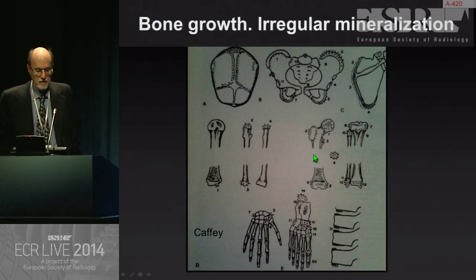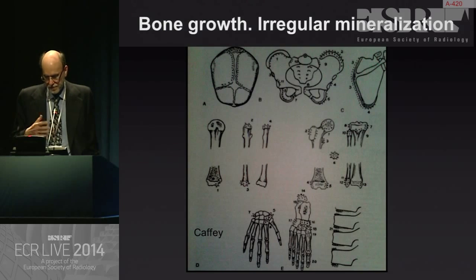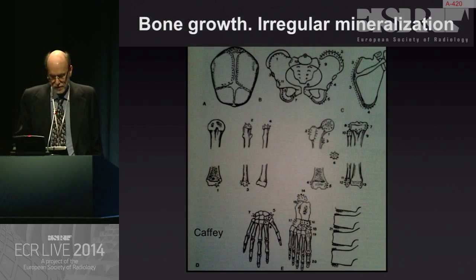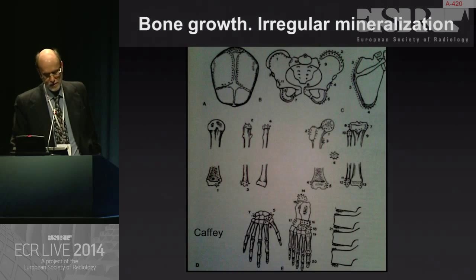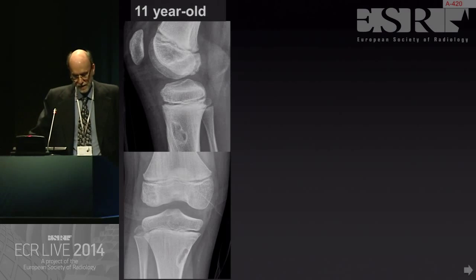Well, there are plenty of areas for irregular mineralization all over the body, as is disclosed in this diagram. We'll see some examples of several cases.